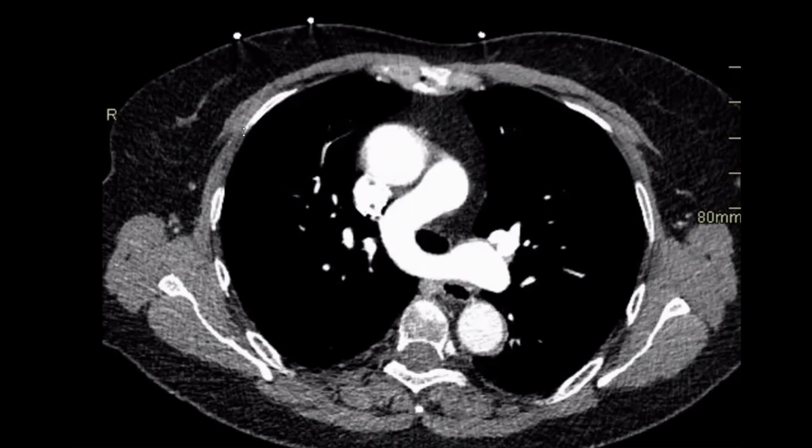I'm seeing there is an apparent left pulmonary artery passing behind the trachea. Yes, you are right. This one is the main pulmonary artery, and the left pulmonary artery is coming from the right side, insinuating itself between the trachea anteriorly and the esophagus. And this one can lead to dysphagia of the patient. So this one is very important and very critical to diagnose this case.